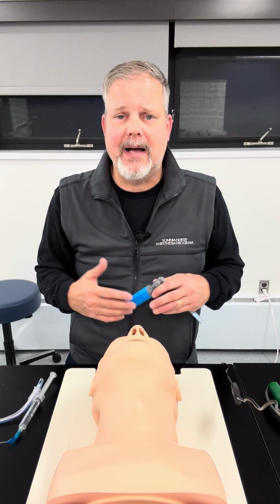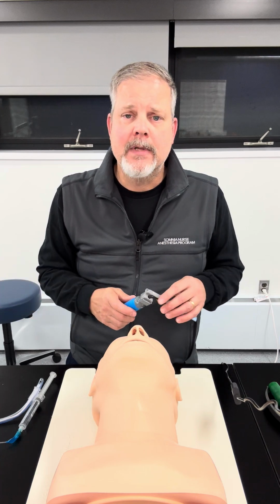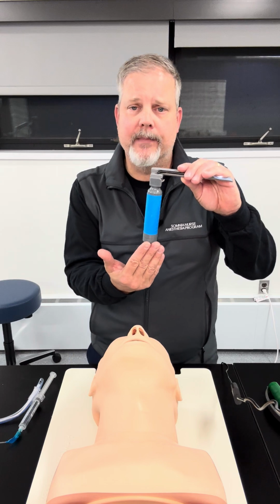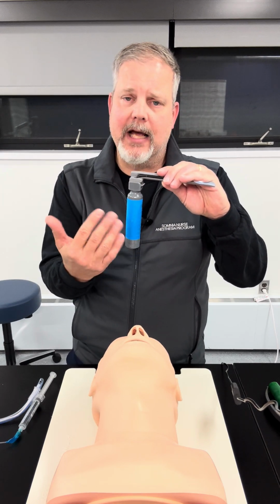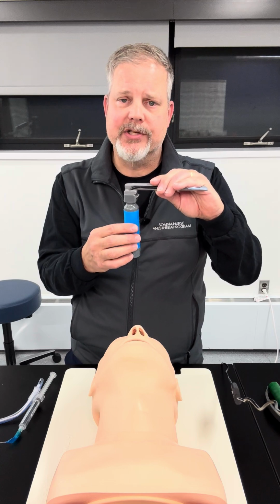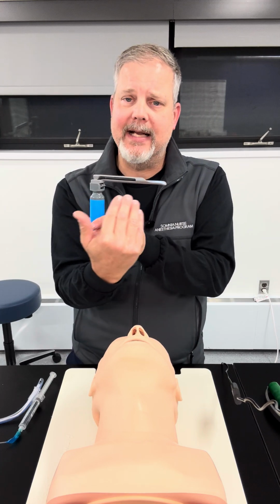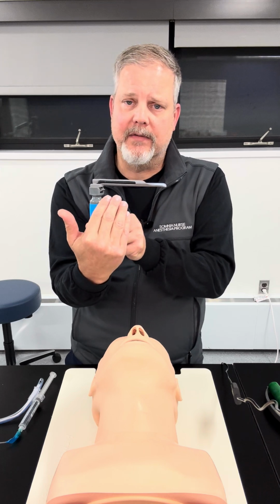When we look at laryngoscope handles and blades, and we talk about direct laryngoscopy of our patient, or what you'll hear us call DL sometimes, we first need to make sure we've got a handle. Here's your handle. This is going to have batteries or something within it that provides power to our light source. So this is a Miller blade. This is a straight blade, as you can see. I'm going to talk a little bit about the difference in the way we use these in a few.